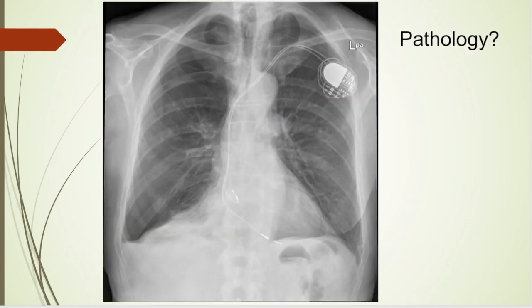And here's an interesting chest x-ray with a lot going on. So let's start off using our simplified method here. A for airways. Come down here. You can see the trachea. Looks like the bifurcation's right about there. It's carina. And it looks fairly good. Looks like it's fairly centered.